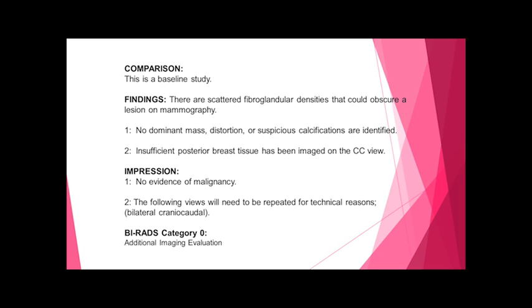Impression: the following views will need to be repeated for technical reasons. What's that technical reason? Insufficient posterior breast tissue image on the CC view. So, of course, BI-RADS category 0. So let's look at the images.